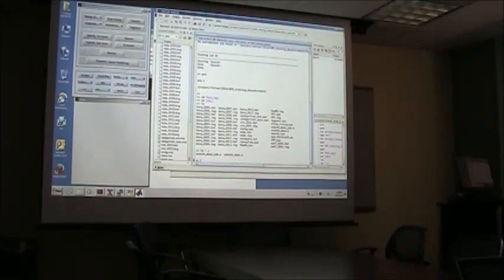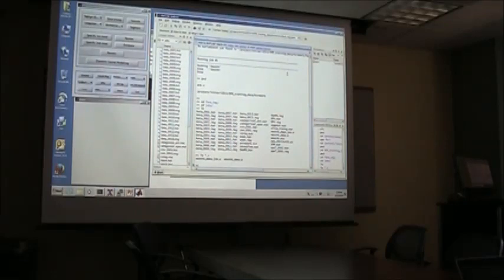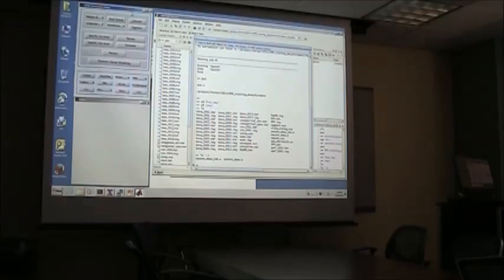The one thing was that last time there were a lot of questions on how to speed it up, and these are a couple of the ways you can do it. I thought I would load up... So last time we talked about the pre-processing, and the smoothing is the last part of that. And what we just talked about before is then to set up your subject level analysis.